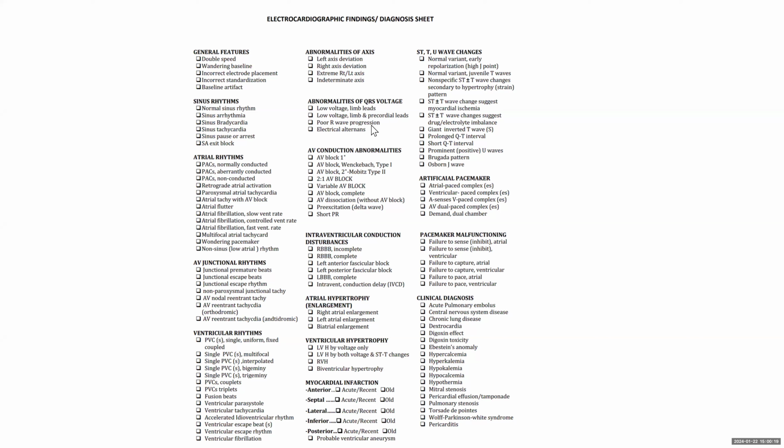If you pace in the refractory period, we call it physiologic failure to capture. Which means, yes, I didn't capture, but not because of malfunction, just because it happened to be in the refractory period. For the exam, I wouldn't overthink things. If you see it, I think it's fair to say failure to capture, because you didn't say it's pathologic. You're just describing the ECG finding.